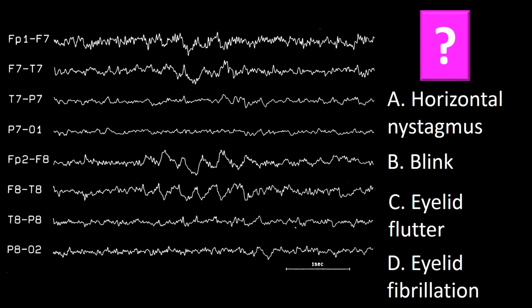Next question. Please look at this frame and choose the best possible answer. A. Horizontal nystagmus. B. Blink. C. Eyelid flutter. D. Eyelid fibrillation.